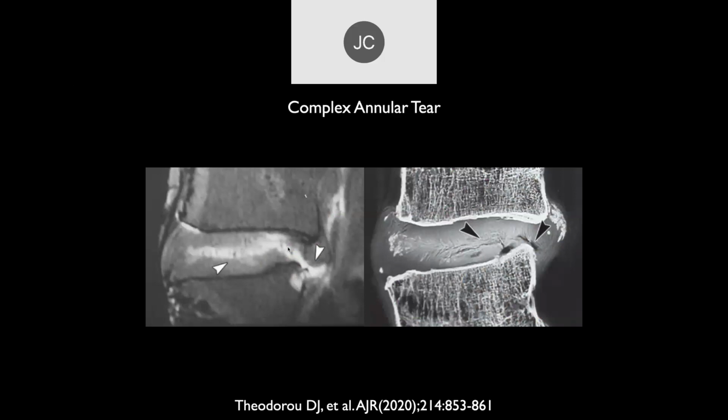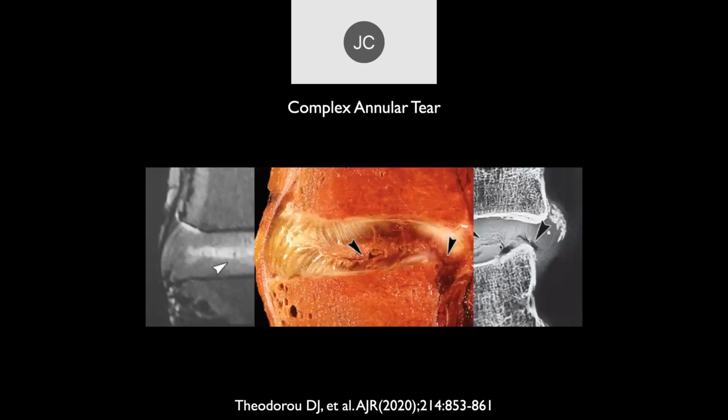Further studies: this is an MR examination showing this phenomenon in a cadaver. And here we can see what the gross specimen looks like, showing that tear of the annular fibers. These are the Sharpey's fibers here, the annulus there, and a focal disc protrusion coming out here. And there you can see where the nucleus pulposus can herniate out into this area. Now, in people my age, there really isn't nucleus pulposus. Most of it is dried up by that time. So true herniated discs, in terms of nucleus pulposus, are typically in middle-aged or younger individuals. And we'll talk about why that may be important.